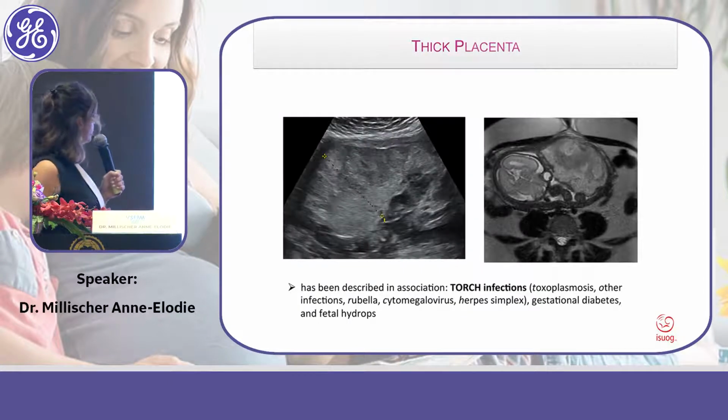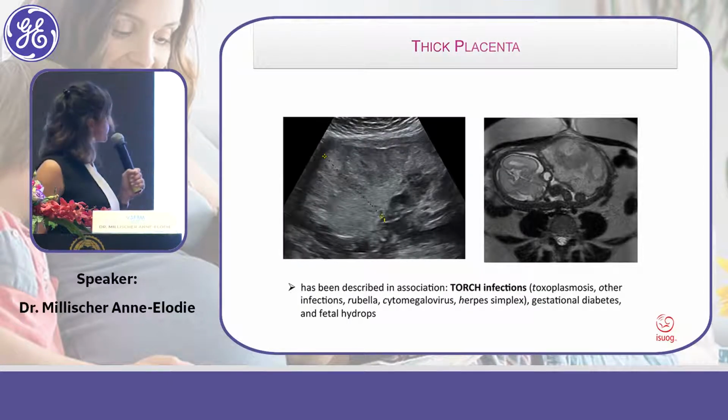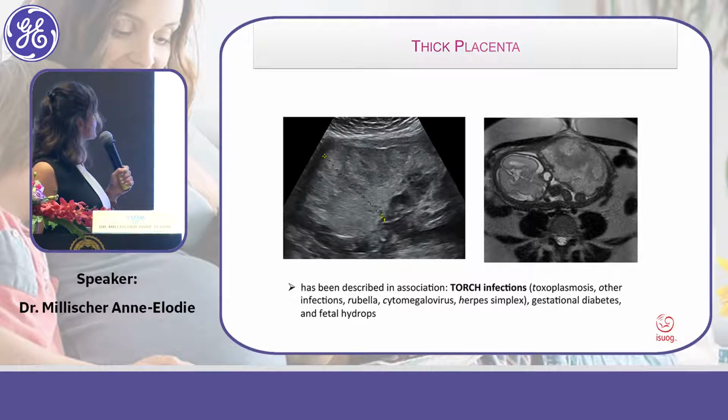But sometimes we see this kind of placenta, a thick, very thick placenta, heterogeneous, with kind of hyperechogenicity inside the placenta.